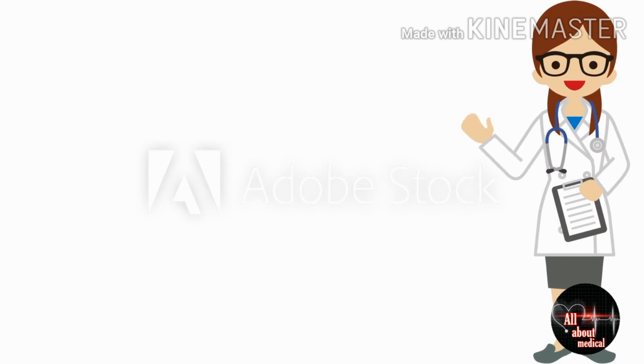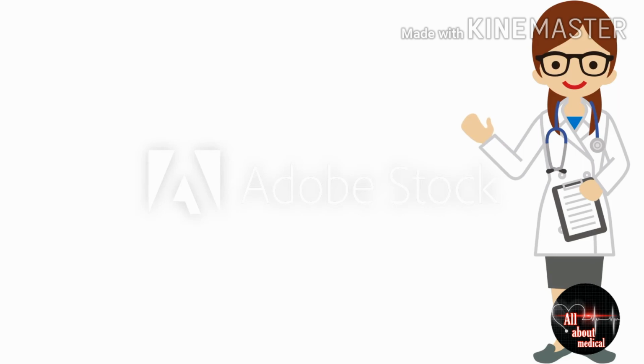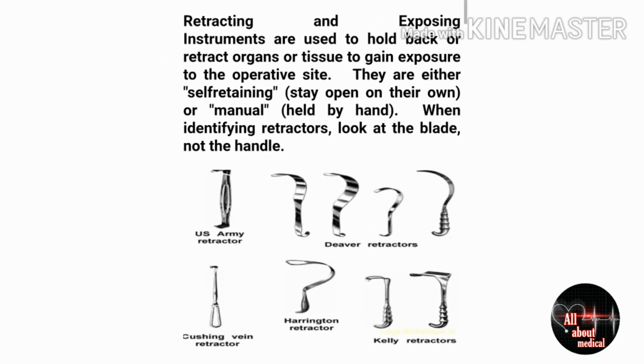Now let's move on towards our fourth and last category, which is retracting and exposing instruments in surgical instruments. So let's start. So this is the first image of our fourth category, and these are retracting and exposing instruments which are used to hold back or retract organs or tissues to gain exposure to the operative site.